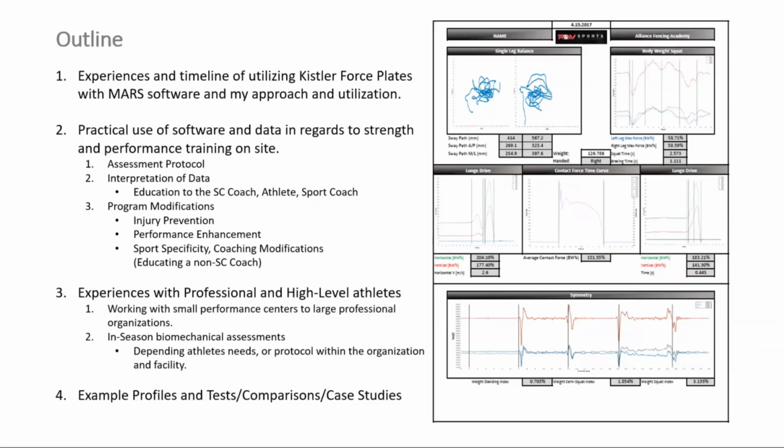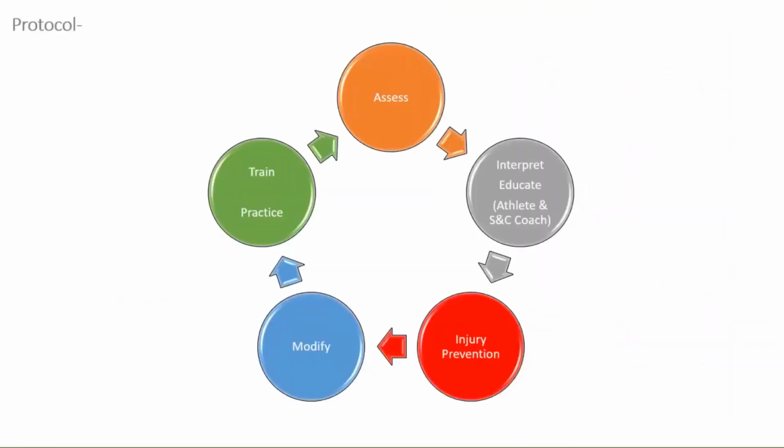And then just some examples of a profile, test comparisons, some case studies. A lot of it's going to be images. And right here on your right is one of the many profiles that I've created in the past, breaking down all the tests that this coach wanted and using the data that they wanted from the test instead of using all the data that we get from these tests, and using different modules in unconventional ways. So my process would be to start at the top.